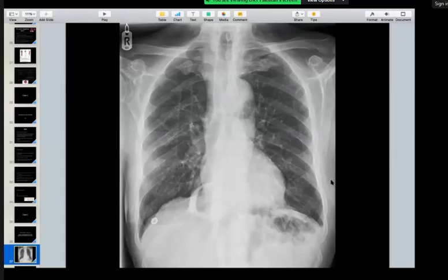There is an abnormality in the right lower zone, which looks like possibly the gastric bubble. This would be in keeping with a previous esophagectomy if it had been pulled up. Can you see any hyperdense structure there, which would point towards the NG tube? You think you can see something linear and hyperdense?